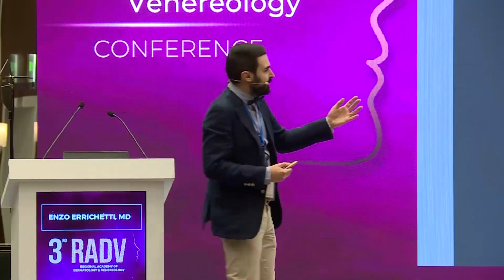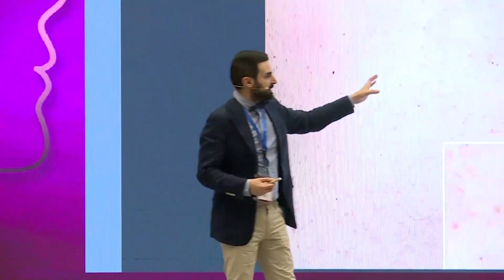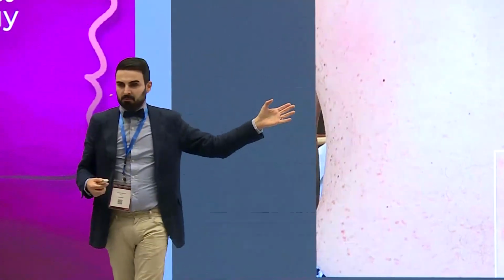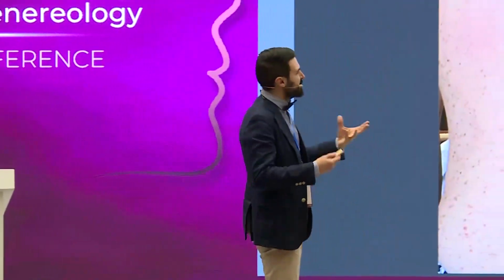I don't know if you have any hypothesis about this, for example. This is more brown. Okay. Could it be lichen pigmentosus? Yes. Could it be urticaria pigmentosa? Yes. Maybe not ashy dermatosis because, you know, lesions are bigger and bluish.